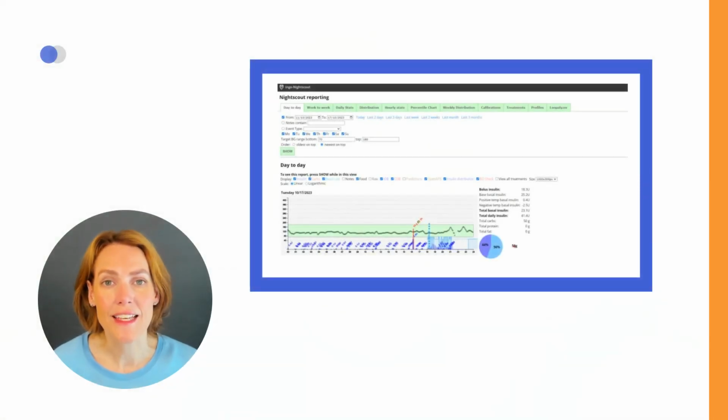By following these guidelines and considering the provided details, you can effectively interpret reports, optimize insulin settings, and ensure proper usage of AndroidAPS for improved diabetes management.